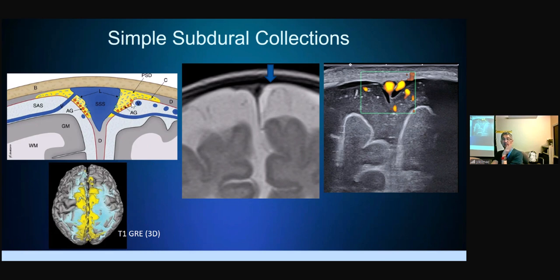So there are arachnoid collections and meningolymphatic vessels around the dura. This is an MRI study showing the lymph drainage in the brain. These blue ones are the lymphatic fluid in the brain, and that's the dura. And most likely we are seeing them on the ultrasound here, but it's not reported in the literature yet. No one knows.